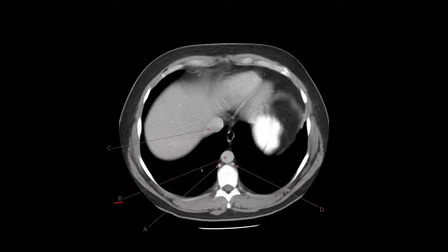That's the aorta, right? It's nice and circular right in front of the vertebrae. And then again, here we see the esophagus too, which I'm drawing an arrow on. So there's the esophagus again. And in A and D, what is A and D looking at?